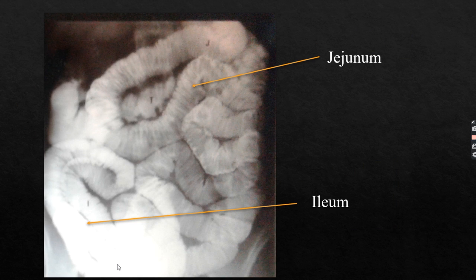so barium meal follow through. Here you can see, just to give you an idea, the minute features are not clearly visible in this abdominal radiograph, whereas even the inside of this bowel, the internal mucosal features, can be seen in the left upper portion of the abdomen. This is the vertebral column. The internal mucosal patterns are clearly visible in this area, whereas in the right lower abdominal part, the small bowel is sort of featureless. This is ileum and this is jejunum, on barium meal follow through.